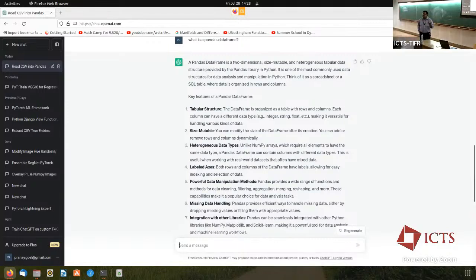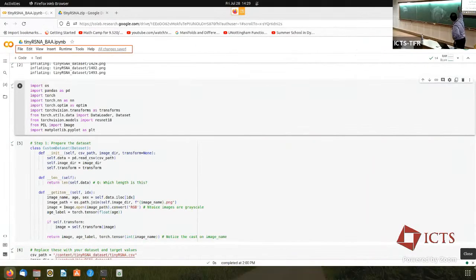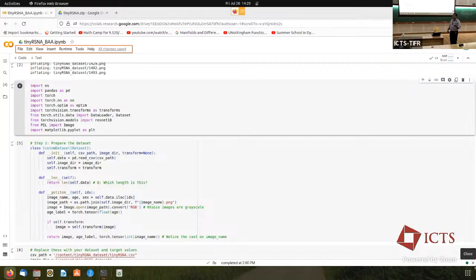So now that makes my life easier. I just have to tell you how these things are constructed, and then you guys can take over. So that's what I'll do. What I'll show you is how this overall structure is constructed. I'll point out some of the salient features or what is it that you need to get done. And then you can interact with ChatGPT and try to get it done. Does that make sense? Okay, so those are my imports. I showed you my imports earlier as well. What's the first step that I have to carry out in order to create a PyTorch model?